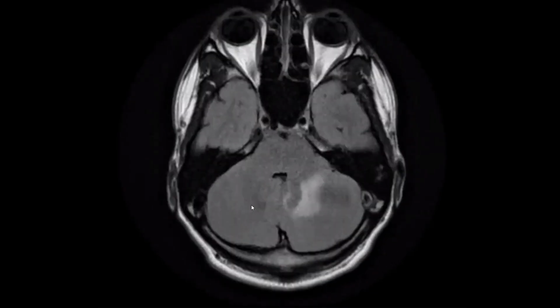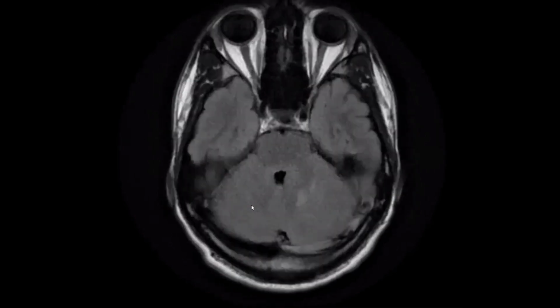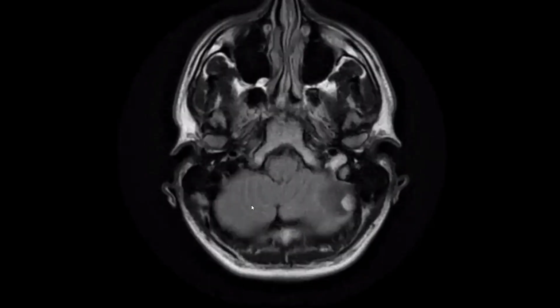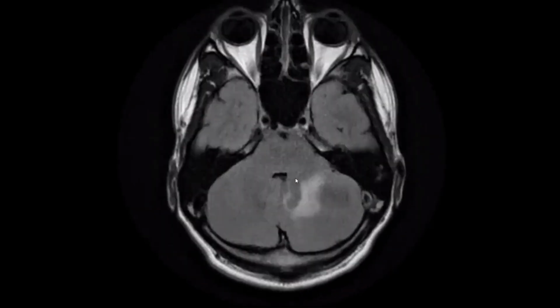This is the axial FLAIR, also showing the vasogenic edema and a hyperintense peripheral eccentric nodule. If the patient is a child, so we have a cystic space-occupying lesion at the left cerebellar hemisphere with an eccentric nodular soft tissue component, or nodular solid component, surrounded by vasogenic brain edema, exerting mass effect in the form of mild encroachment of the fourth ventricle.